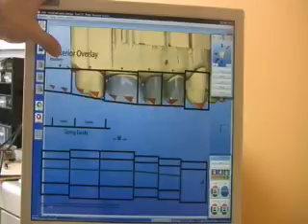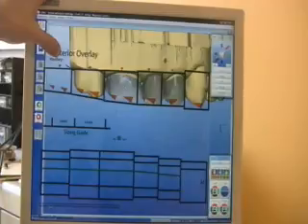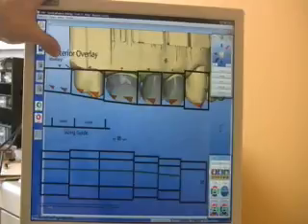so we will go through and double click that proposal. It will highlight, and then using the scale tool we'll be able to shrink down the mesial-distal width of that proposal and move the restoration back until we get a good contact. When that happens, you will see that the contact between the first molar and the second premolar is opened up. So we'll expand the second premolar mesial-distal a bit.